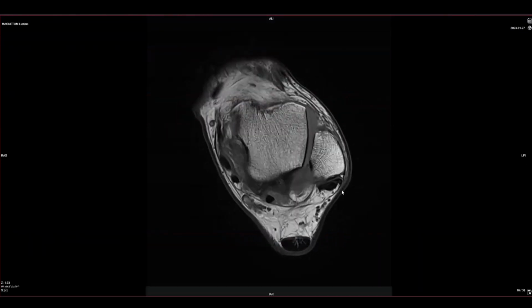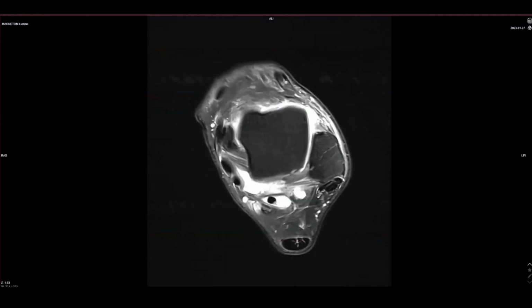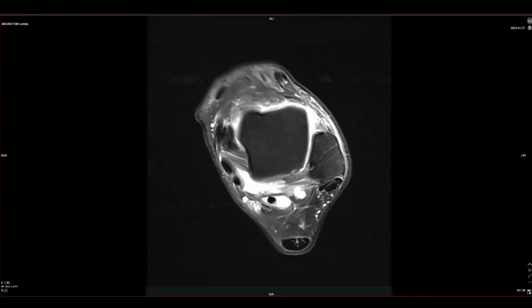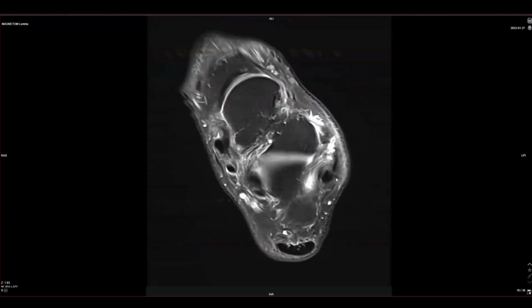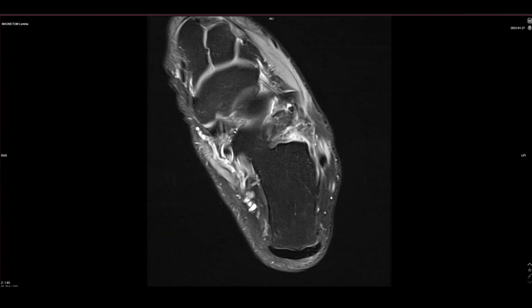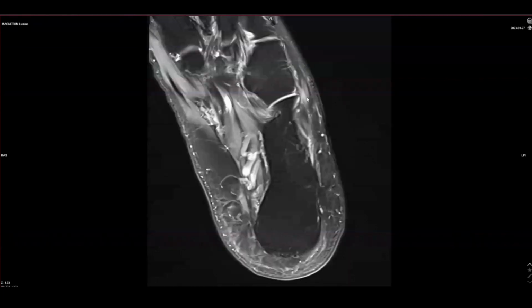Now at this time we can see the superior peroneal retinaculum. Always want to see the fibrous ridge has some amount of elevated signal, but there's no pouch formation. The band is intact, and I see the two halves of the brevis. Notice there's a wavy split tear right there. So initially we see that the inframalleolar peroneus brevis is tendinopathic, and then there are interstitial tears that extend to the insertion, and we can see this better on a coronal image.